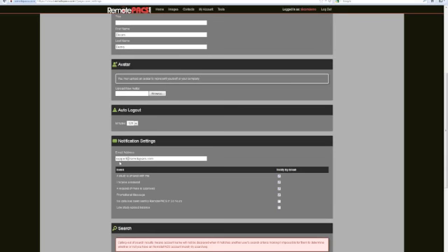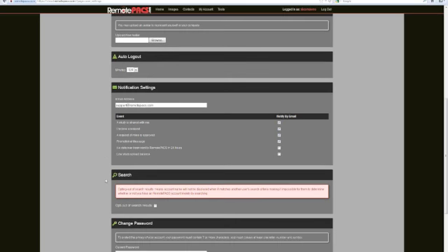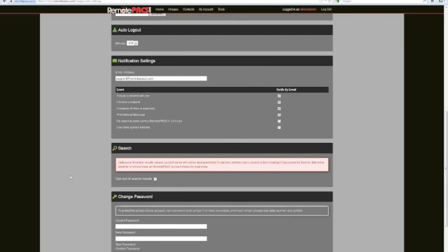Now, we also have some account notification settings in here. So a lot of times a referring physician will want to be notified when a study is available for them. This button is checked by default, and it says that when a study is shared with them, they'll receive an email. And there's a couple of other ones here. You can opt out of promotion messages or requests from other people to link to their account, or low study upload balances, and other things like that. You can also modify your password.